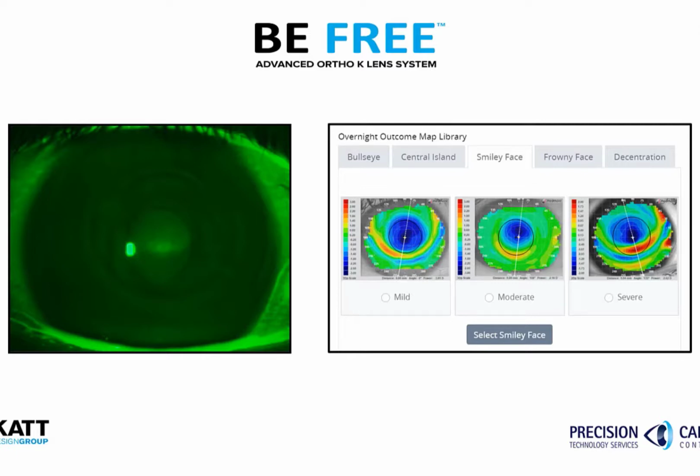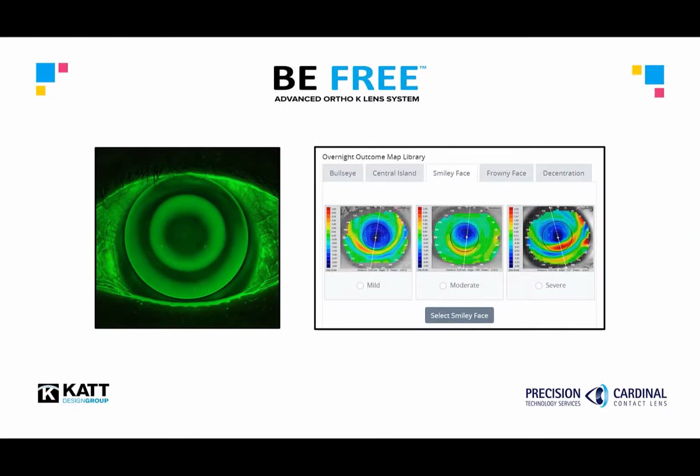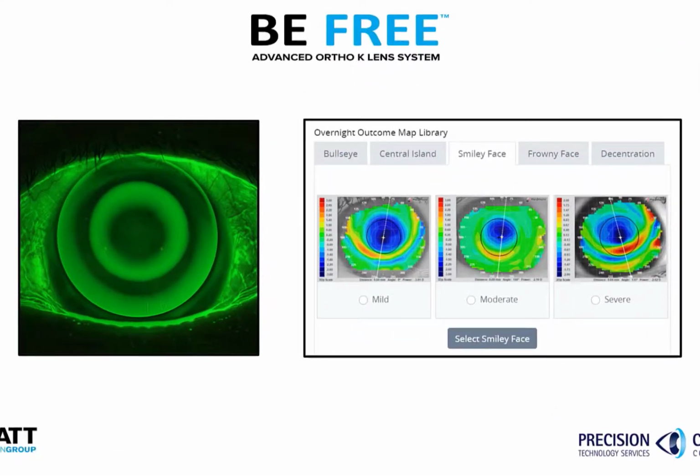Select mild for extremely light touch, moderate for significant staining, or severe when the lens is heavily bearing. A patient that's uncomfortable due to excessive edge lift or a very loose, sloppy fit can also be resolved with the smiley face response. Again, choose mild, moderate, or severe based on the apparent magnitude of change required.